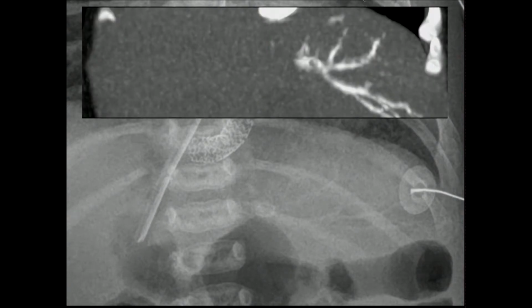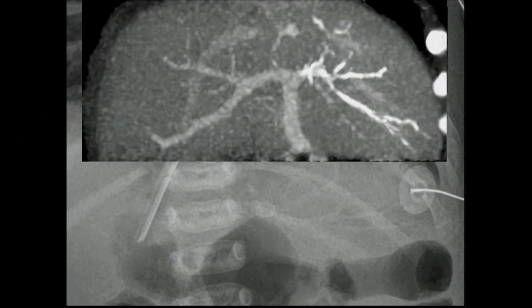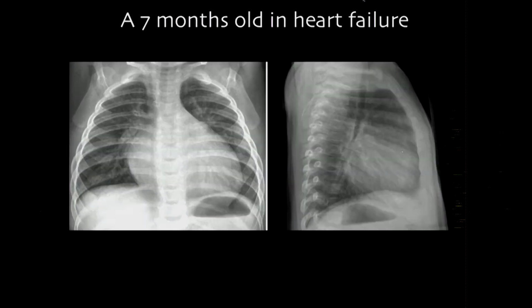So this is a CT scan before contrast injection, okay? If we have some finding, instead of discarding that finding, just think about what the possibility could be. And then this is after contrast injection. This is the portal vein, the right portal vein. The left portal vein is completely occluded by calcified thrombi, okay?